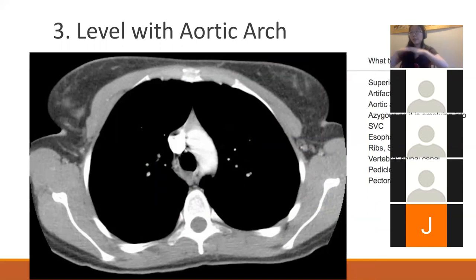So what big vein are you going to expect to see? Are you going to see the superior vena cava or the inferior vena cava? You're going to see the superior vena cava. Okay, and this right here is another vein that looks like it's emptying into the superior vena cava. What do you guys think that is? This is going to be the azygous vein.